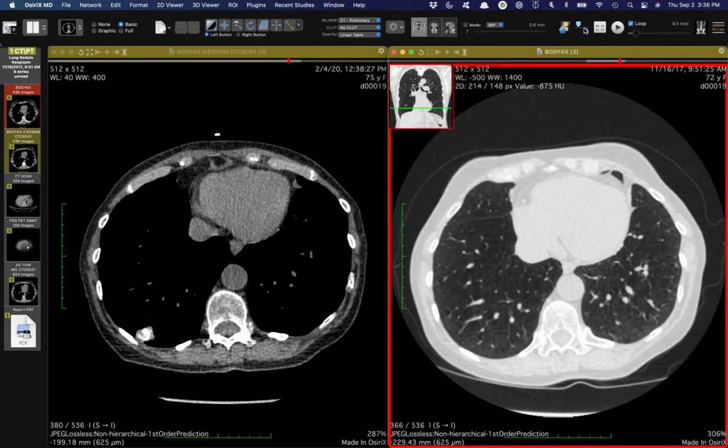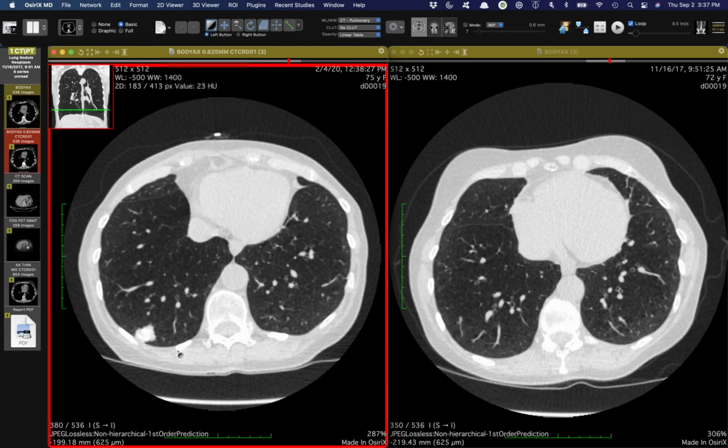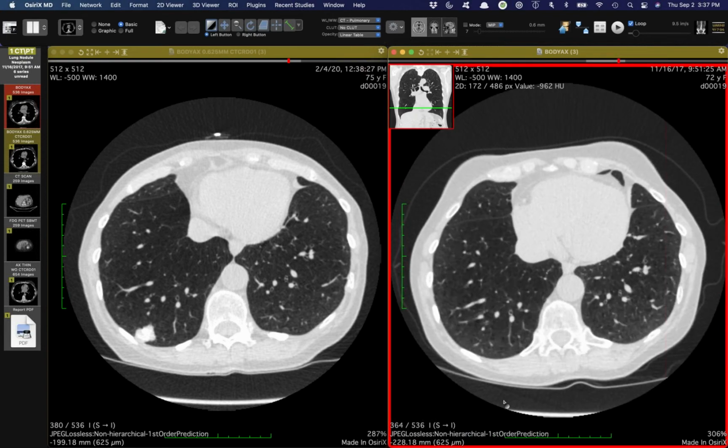It might be an adenocarcinoma growing on a granuloma, so kind of a scar carcinoma sort of thing. Yeah, exactly, like a collision tumor consuming it. Yeah. Well, it might be dystrophic calcification in a carcinoma. The lesion is also inhomogeneous.